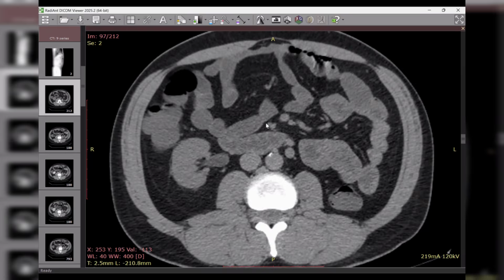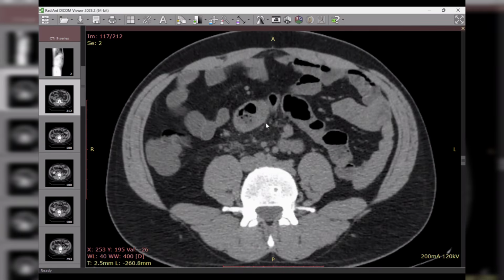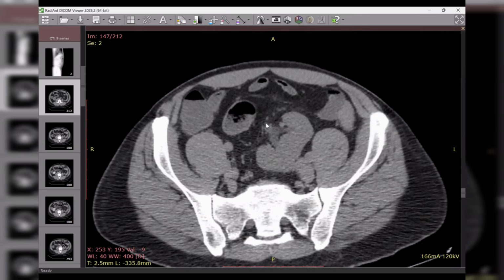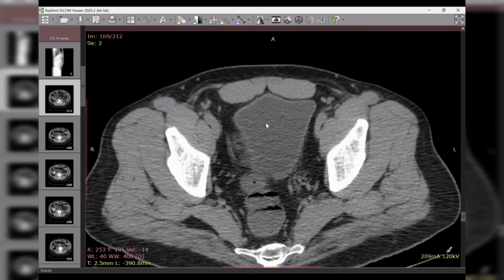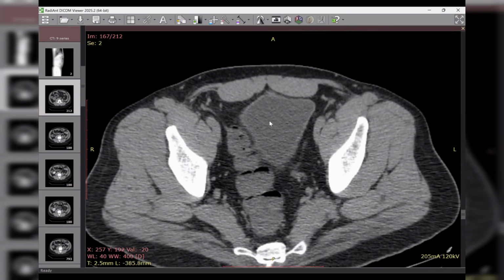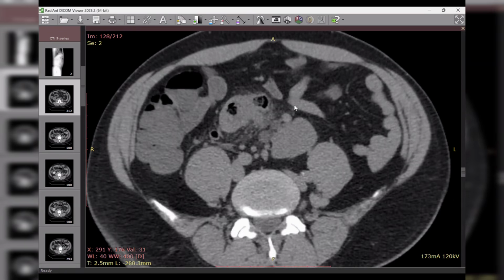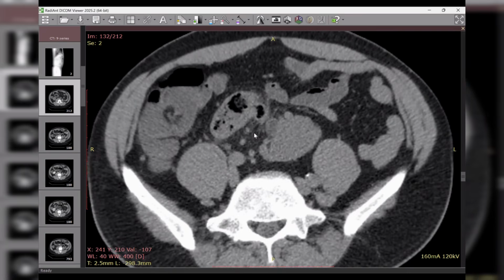So the patient has presented with pelvic pain, so I will go down completely before giving comments. Okay. I noticed that there is an ectopic left kidney, which can be seen in the pelvis. I had also spotted some fat stranding somewhere in the middle. Yes, so in this region, there is thickening of the bowel as well as fat stranding.